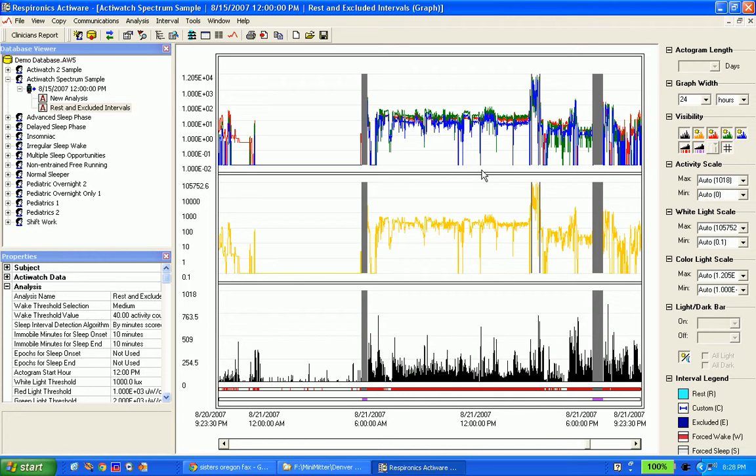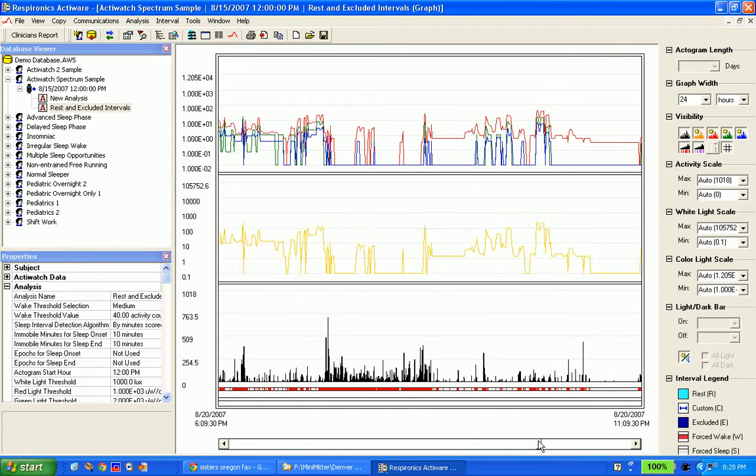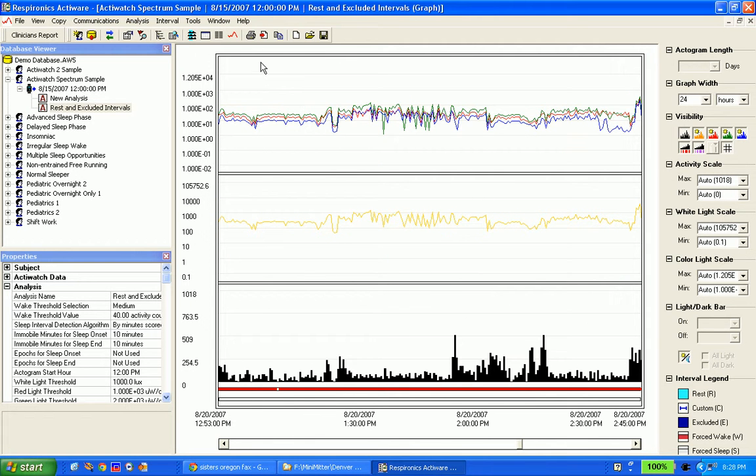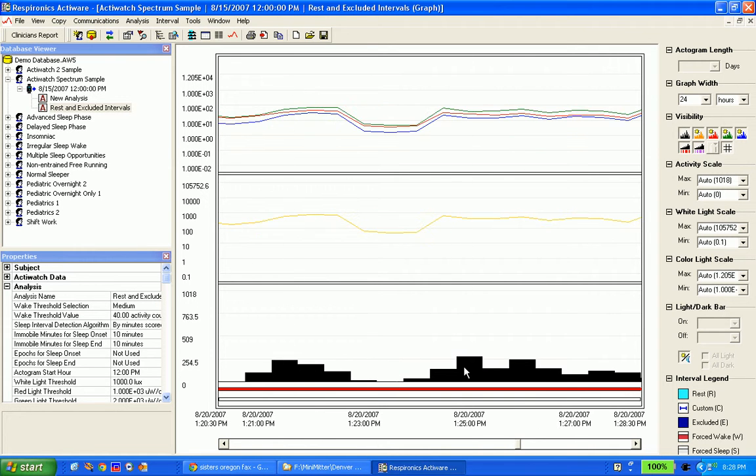As we scroll across, we would repaint them, and it paints so fast you actually notice no hesitation, no latency, nothing. It's really pretty amazing. And what's further amazing, most of the commercial graphs, if you were to zoom in like this, they would simply take the area that you've zoomed into and graph it. We expand that area from here to here, but we've repainted the entire data set at whatever resolution that ends up being. So I can keep expanding this to a point where every time I do this, I end up with a larger and larger data set. So this thing is just huge.